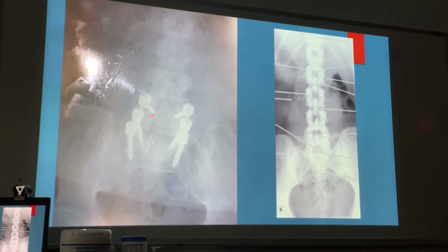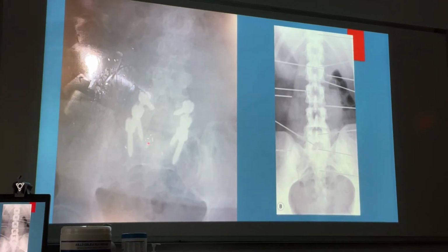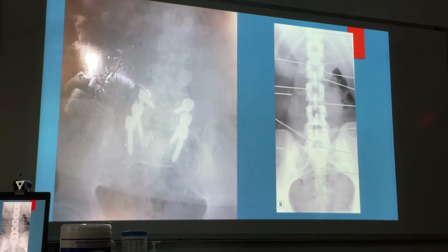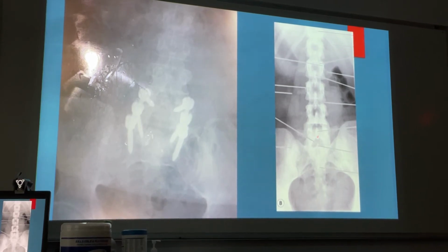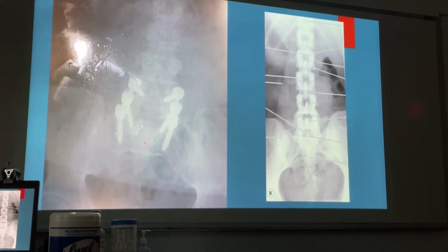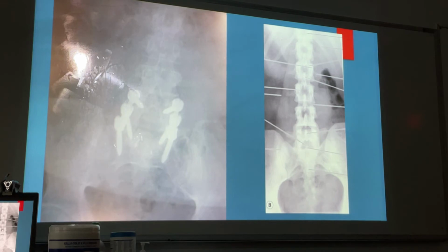So if you've never seen surgery before, the teaching point is this is metal, okay? These are usually disc struts, meaning they try to hold the disc in place, old style, okay, but the observation is more than that. What's the observation? No spinous process. Now, I don't have the lateral on this one, but the teaching point is it's metal. There's been laminectomy intervention, spinous process removal, okay, and what does that mean to you clinically is the big question.